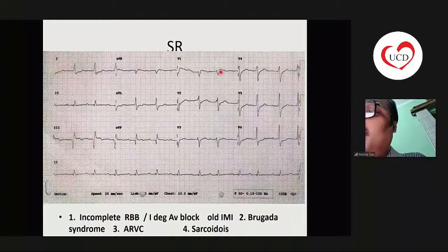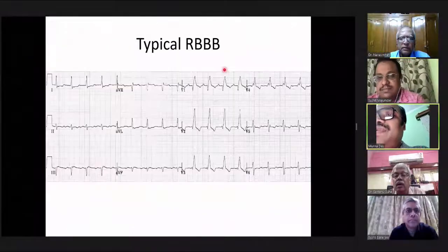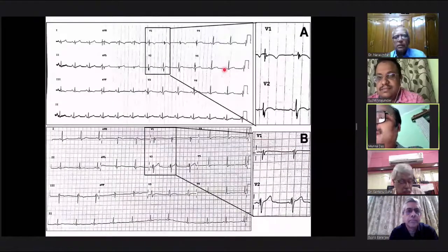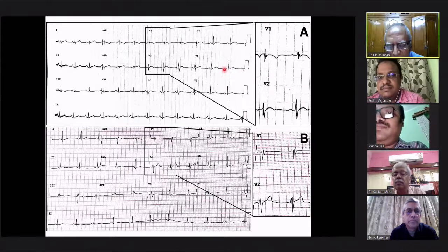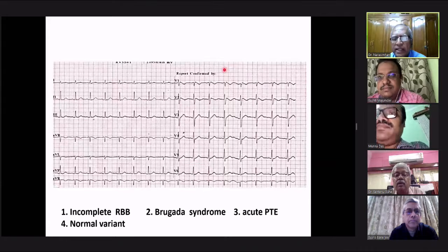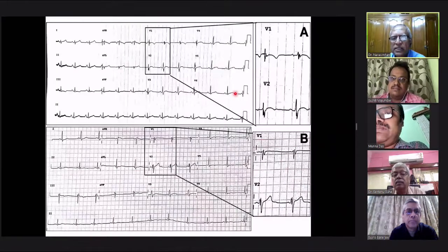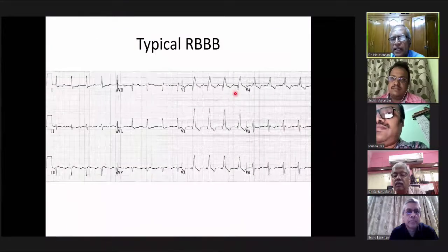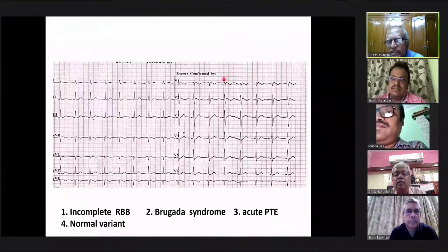And sir, one thing in the Brugada diagnosis, the guidelines have not yet included the Chevalier's angle. No, the thing is, when practically a physician is seeing 100 patients, if he sees an ECG like this in a person who has presyncope versus a person like this, typical right bundle, how does he think of Brugada? Just look at this. That is what we are emphasizing.